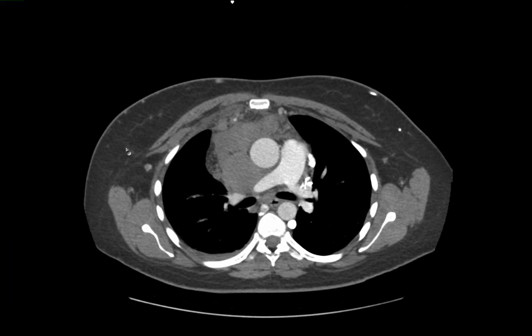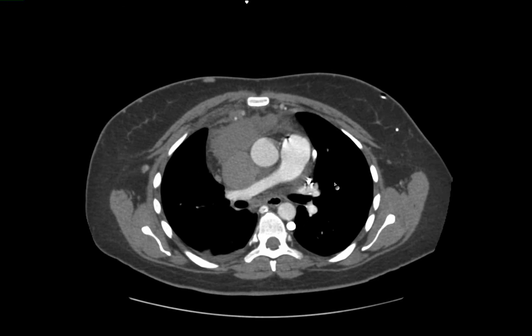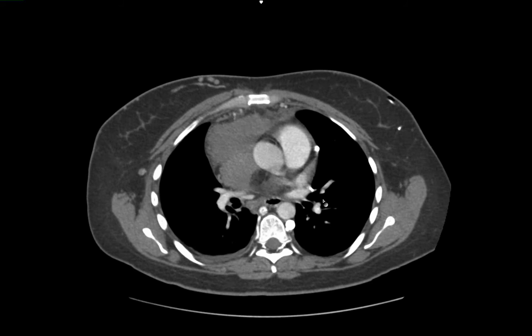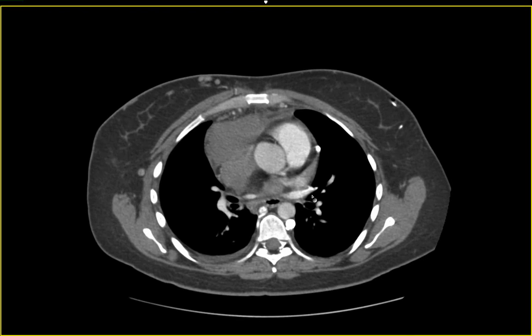So the usual pathways are involved, but one pathway which we've shown before that is involved here involves the left pulmonary vein. As I scroll through here, you'll get to the point just about here where we see those systemic vessels and those pleurohilar vessels spurt into the vein right now, right there. And that vein lights up quite nicely. So those two images right there and there show a collateral emptying into that pulmonary vein. And we've seen that before. This is a really nice example of that phenomenon.